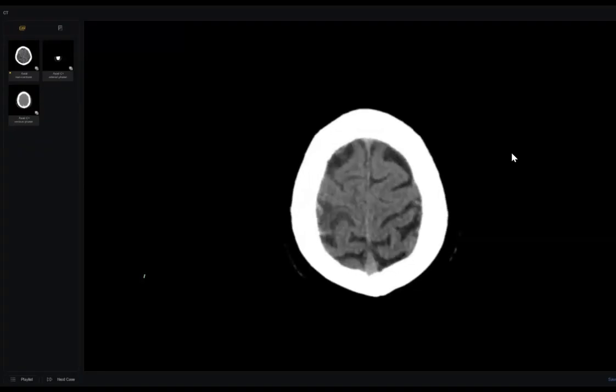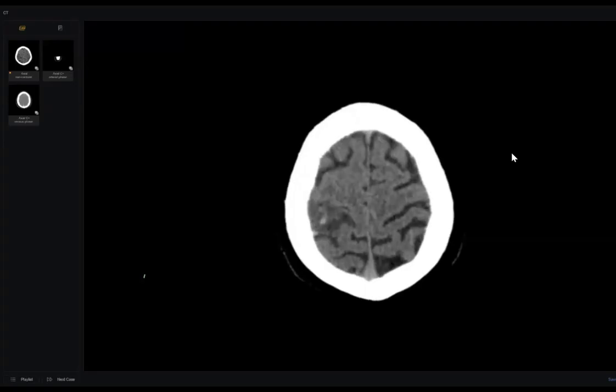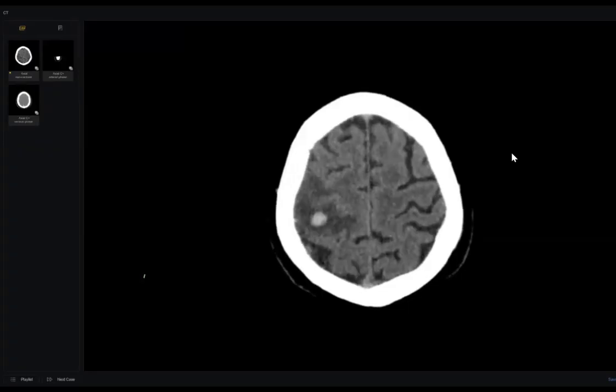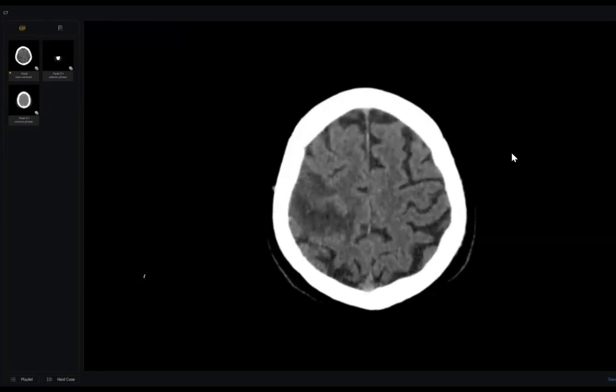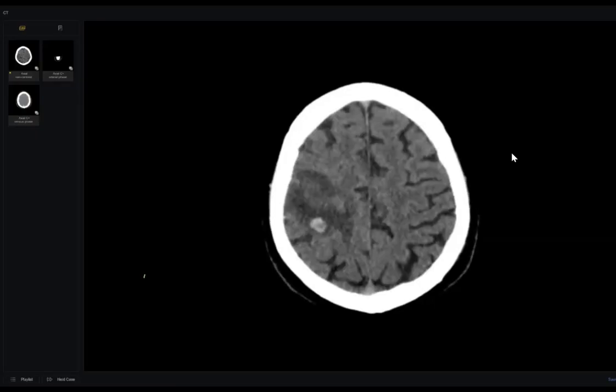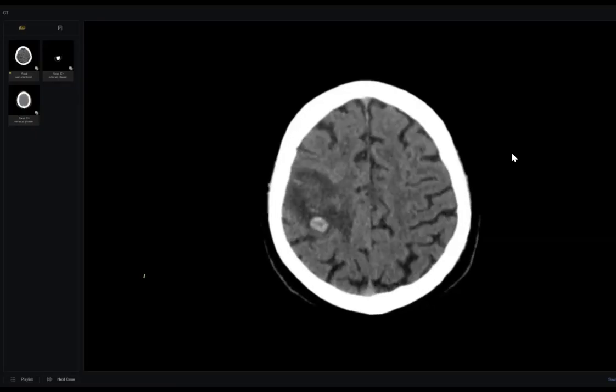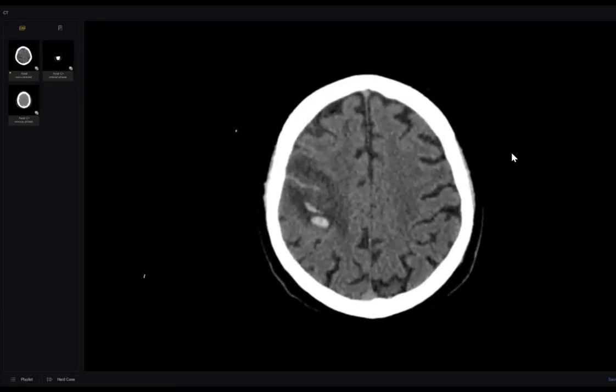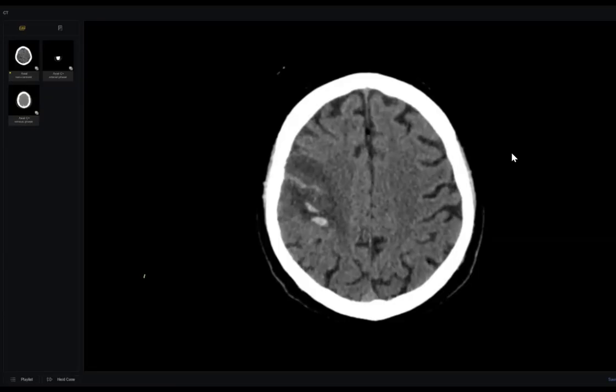of an 85-year-old man who presented with severe headache, and these are plain images. And I will go through the images. I can see a hyperdense focus in the right parietal region with marked surrounding edema. However, I cannot see any significant mass effect or midline shift in this case. I will further scroll. I can see another similar looking focus, and I can also see there is some hemorrhage in the subarachnoid spaces as well.